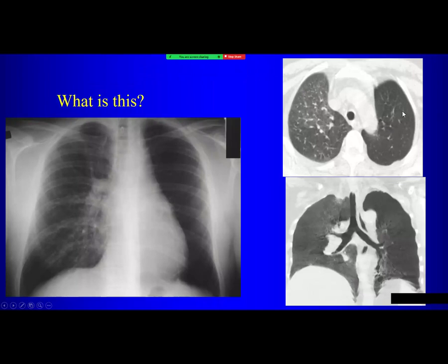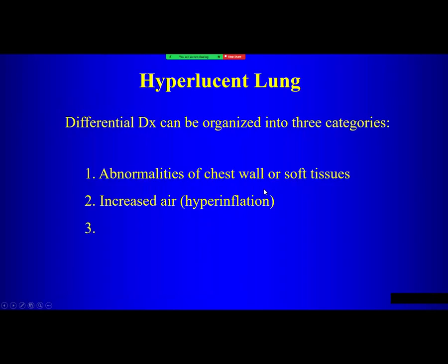So here you can see on the CT, again, look at the vascularity, diminished vascularity. The lung is smaller, hyperlucent. So this is a sequela of childhood viral infection from bronchiolitis obliterans, that is Swyer-James syndrome. So we've gone through some causes. You have a question? Okay.